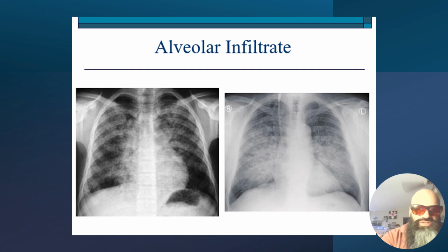So in this example here, we continue with the alveolar infiltrate. So we have our bronchi. They basically meander throughout our entire right and left lungs. They have bronchioles, which are like smaller branches, and they end up terminally at the alveoli. So you will start to see these anatomical structures much more clearly when they're filled with fluid.